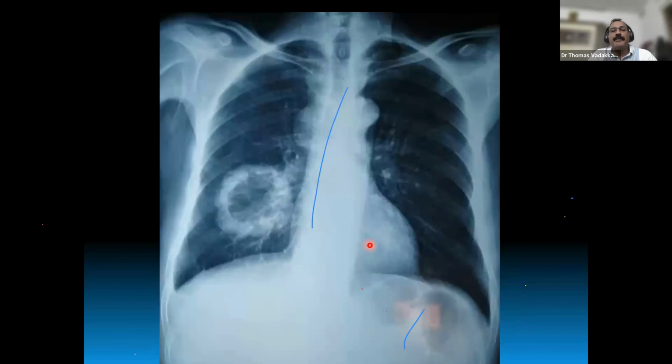This is one of our patients who is a smoker for many years with a smoking index more than 900, came with loss of weight, hemoptysis, clubbing. What could be the thing?